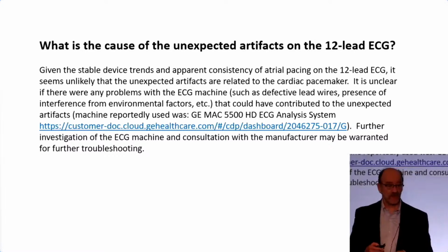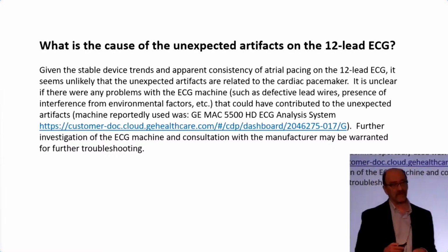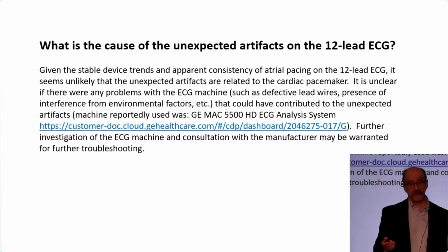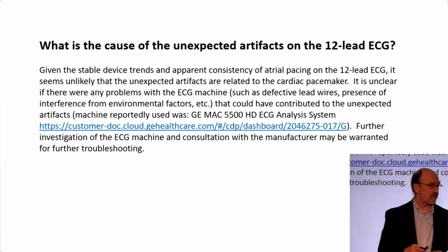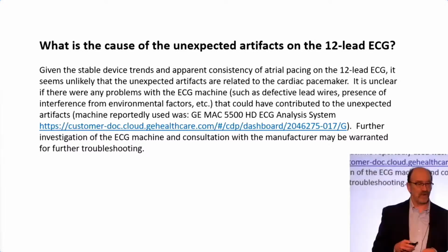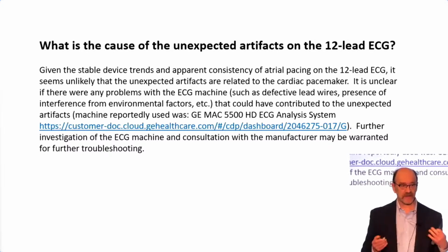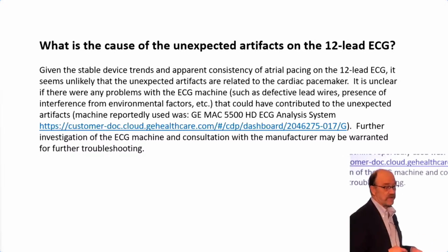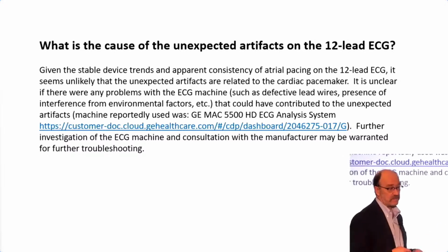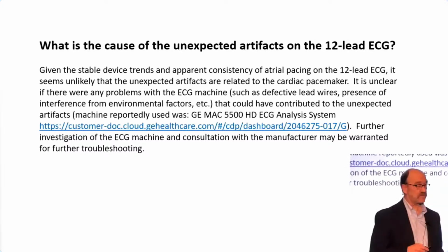And of course, a lot of how big the artifact is, somebody brought up how big is the artifact, will depend upon the sampling rate of EKG machines. They're fairly standard. So I don't know. I think it must sense something and then must produce an artifact, amplify whatever the signal is that it senses, but I have no idea where it comes from. It was not a problem with this patient's pacemaker, and you see it extraordinarily rarely.